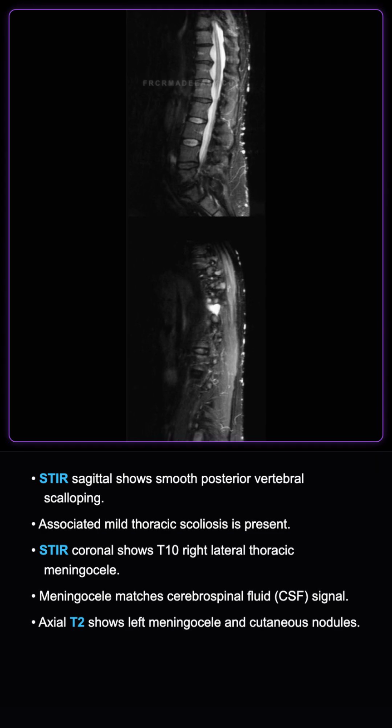A 33-year-old male presented with lower back pain. I am showing you sagittal STIR, coronal STIR, and axial T2 weighted spinal MRI scans. Describe the findings. Let me just study this for a second.